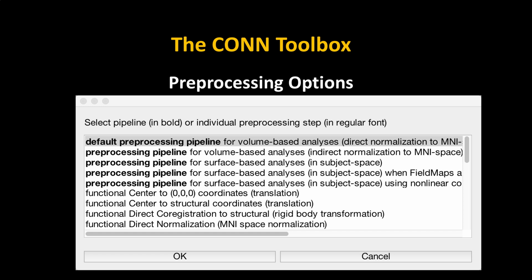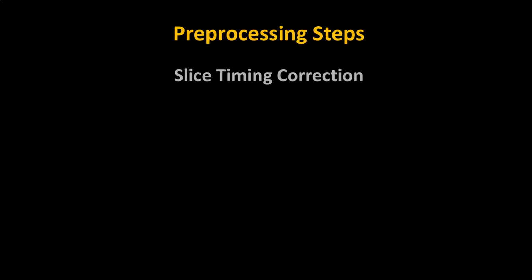It has some advantages. With a surface, you're much less likely to have data being smeared across, say, gyri, right? So I could have a single voxel encompass two very distinct regions, if there's, say, a fissure here. But surface removes all that, and you can also get some very nice figures from that. Although we can cheat a little bit and render everything on a surface, even if we didn't analyze it on a surface, which makes CONN useful.